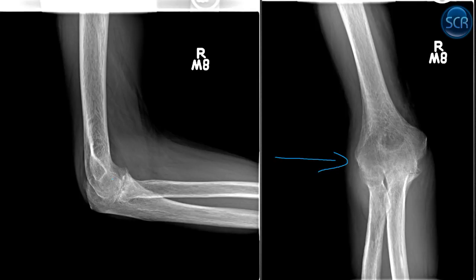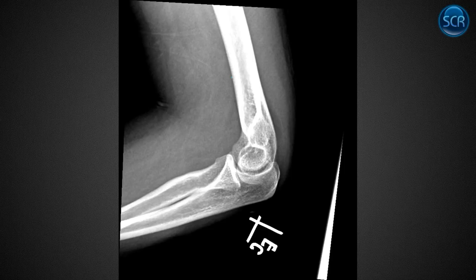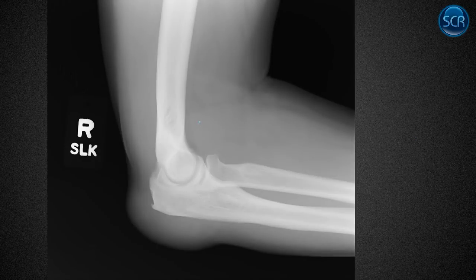If the history fit, if they had more acute symptoms, fever, etc., shorter duration of pain, this could be a septic joint as well. Here's a more typical example of an inflammatory elbow. You can see they've got a big joint effusion, so they're having acute, non-traumatic swelling. If this were inflammatory joint disease that's monoarticular, you do worry about infection. But this is a person with RA. People with RA can get infections as well, at a higher rate than the average population. That's something to keep in mind.